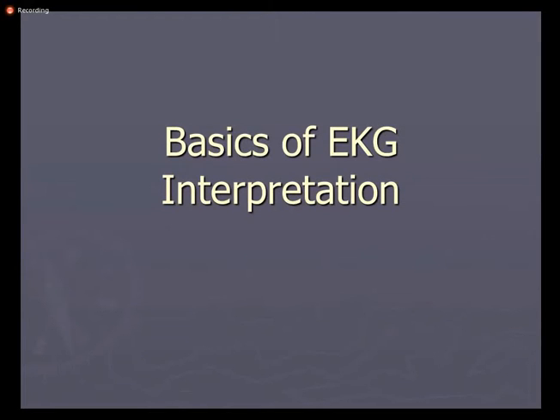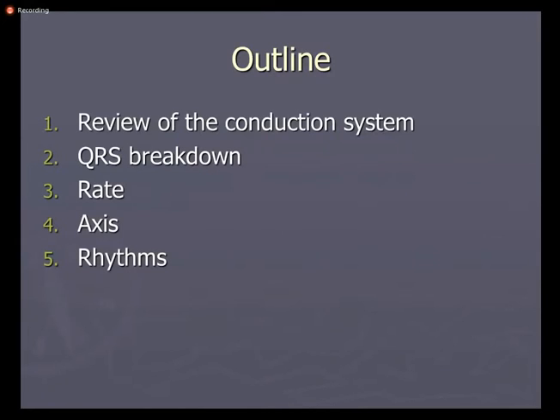And the most important thing in third year: anybody who wants to learn EKG should know how we start to read a normal ECG. The outline of this lecture: what is the conducting system in the heart, what is the QRS complex, how we can calculate the rate, what is axis, and what is rhythm.